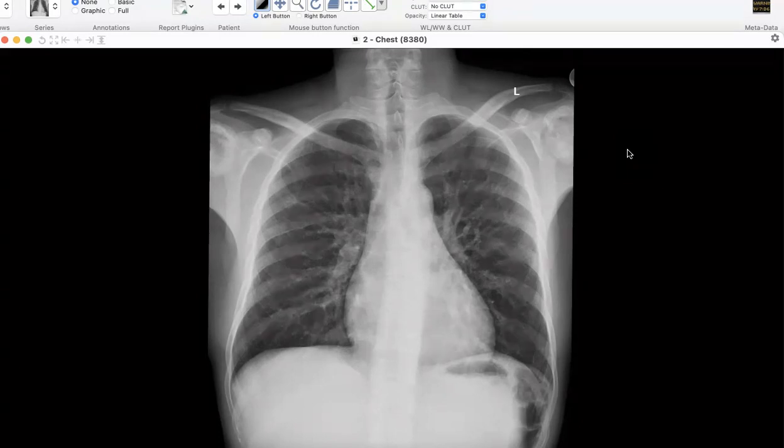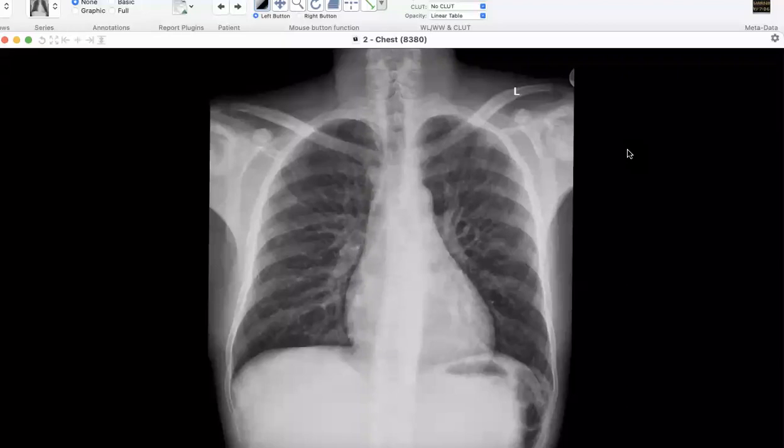I think it's okay because there is increased blood flow, but have you completed your search? Can you tell me about the rest of the film? There are bilateral hyperdense humeral heads with sclerosis, and there appear to be H-shaped vertebrae, and all of this is suggestive of sickle cell disease. I would correlate with previous films if available, and if it is the first presentation, I would convey my findings to the referring physician. Any other findings that you're seeing in this X-ray? Anything else you would like to tell me?